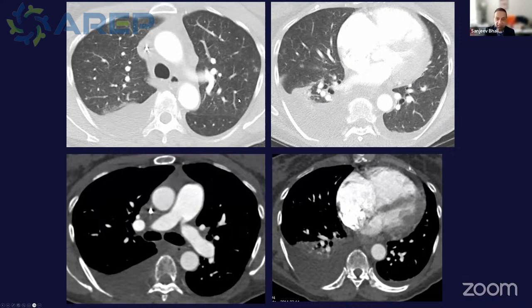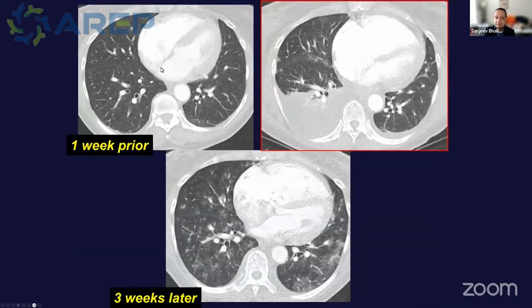On our first glance, we saw no pulmonary embolism, but we all appreciated the right heart had gotten much bigger. And there are these very tiny ground glass opacities. This patient had a history of ovarian cancer, and we could see the change in the heart, and we were suspicious that this patient had tumor microemboli. Unfortunately, they progressed, and this patient ended up expiring from their microscopic diffuse tumor embolic disease.